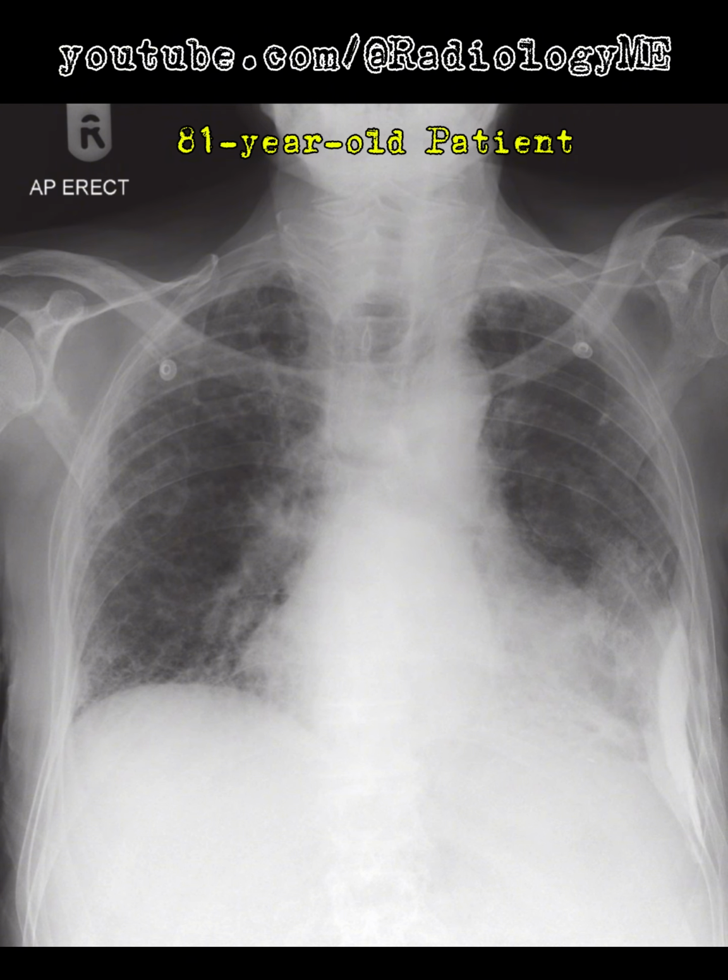It extends laterally from about the 6th to the 10th ribs. And honestly, when I see something like this, I'm already thinking pleural plaques, especially calcified pleural plaques, which are a hallmark of asbestos exposure. Looking more closely, I notice that the calcification is relatively well defined, and there's this other opacity that's projected more medially, which further supports my initial thought. Everything about this really suggests calcified pleural plaque disease.